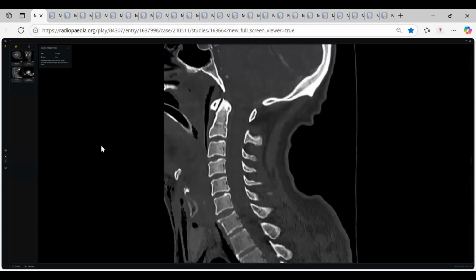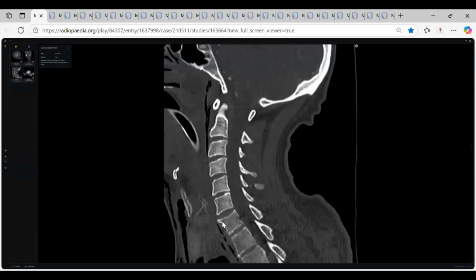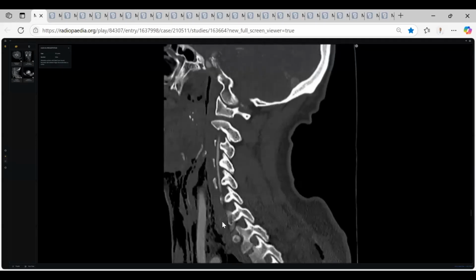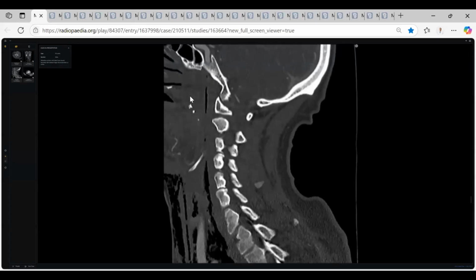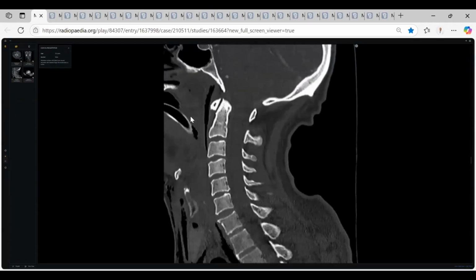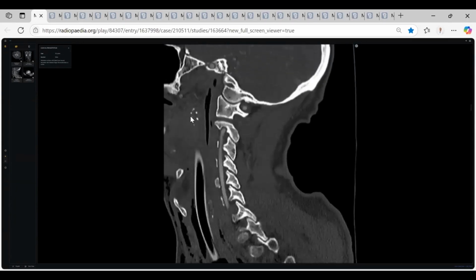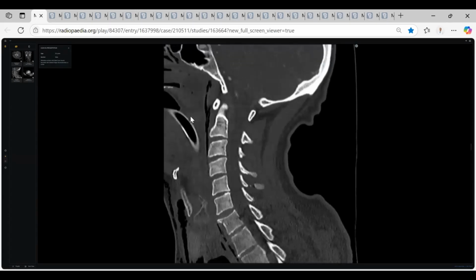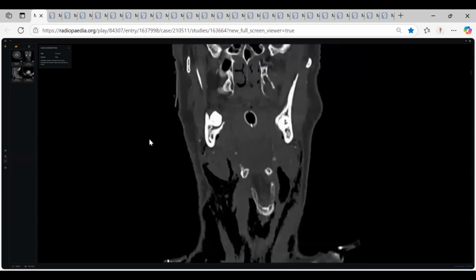Besides that, there are many minor findings like this corner fracture, but the patient will not die from this very minor fracture. Second, you forgot something important: some oropharyngeal foreign bodies, multiple, maybe broken teeth, maybe something else. And you forgot to tell me there is a nasal tube. You must comment. But overall, thank you very much, Dr. Roshni, you did very well. This is the thyroid cartilage fracture, my colleagues. This one.